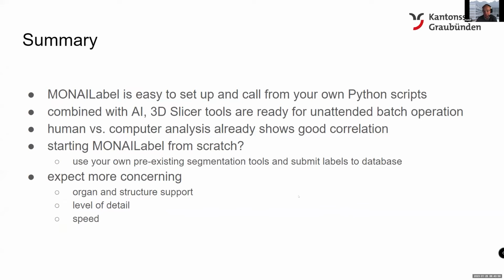So in summary, I find it still quite easy to set up and call MONAI Label from your Python scripts, and it's now ready for unattended batch operation. As I showed you, you don't have to do anything manually anymore. Human versus computer analysis already shows a good correlation.